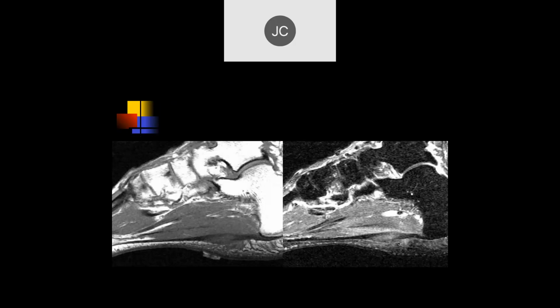They can occasionally have redness, so the old definition of inflammation may fit, but biochemically, these are not inflammatory lesions. Biochemically, these are tears of the collagen fibers, and histologically, that's what they are. Here we can see more of a distal injury, which is less common.